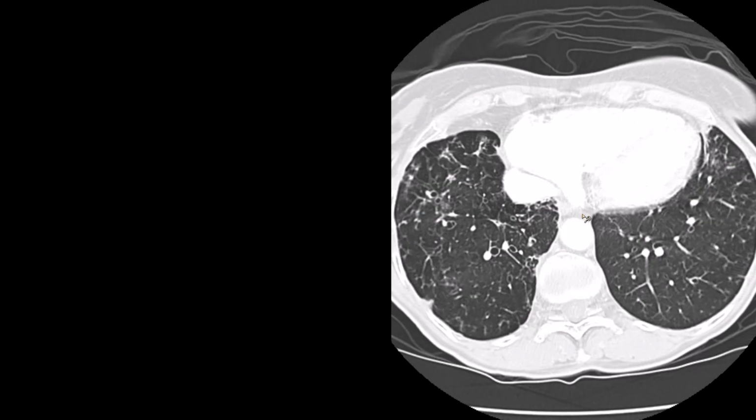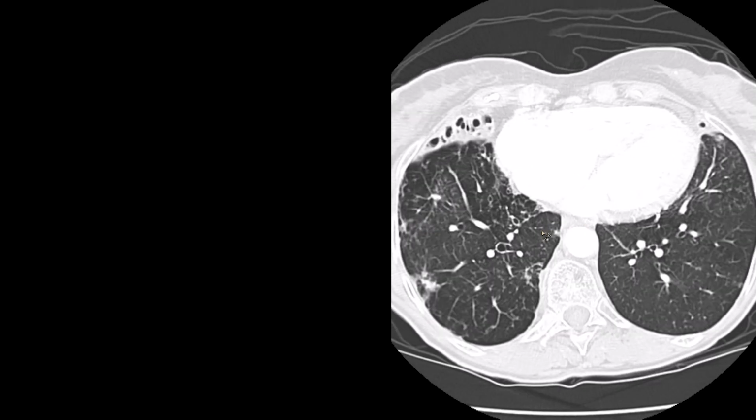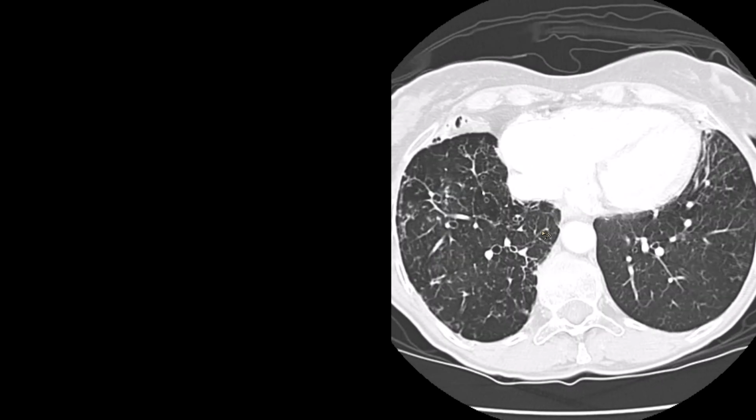The other thing to note here is look at the difference in the density between the right lower lobe and the left lower lobe. The right lower lobe has more disease, and we don't have expiratory images on this study, but if we were to do an expiratory, I could tell you that these areas of lower density in the right lung will remain low in density compared to the left lung. So remember that Nontuberculous Mycobacterium is a disease of the small airways, so we expect these patients to have some degree of expiratory air trapping.